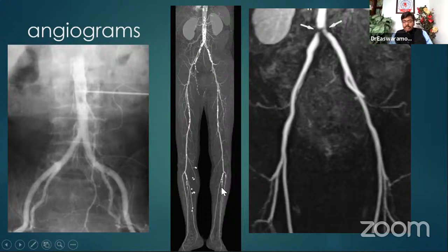Always the central one is the peroneal vessel. The central peroneal artery is purely muscular. It disappears into the peroneal muscle compartment, whereas anterior tibial continues as the dorsalis pedis, and posterior tibial continues behind the medial malleolus into the plantar arch. So both can be seen nicely.